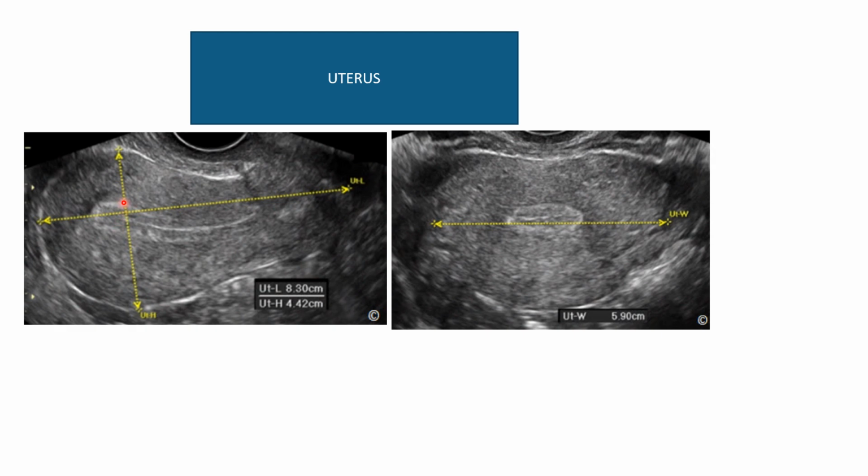endometrium like that. Otherwise, you might think that the endometrium is normal when it's thickened, when there's endometrial hyperplasia or endometrial cancer. So just have a look around the uterus and in the surrounding areas if there are no masses or any other pathology that you can pick or identify. According to my own assessment here, this uterus appears perfectly normal.